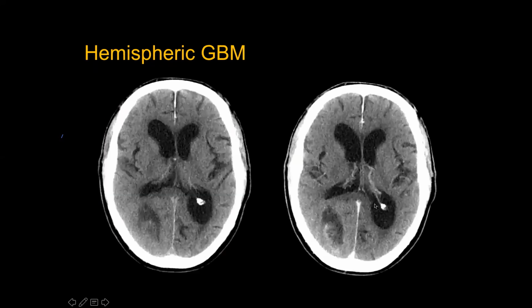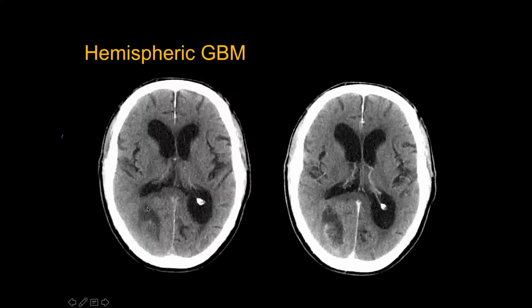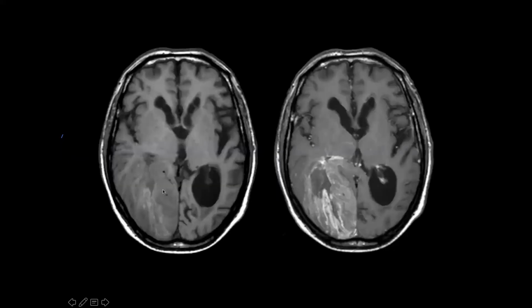But glioblastoma can come in different guises. They can have irregular appearance, solid bits, irregular enhancement, and yet no edema around it. Look at this on CT. It looks just like a solid lesion with no edema, and all these areas are actually tumor on MR. See all this? This is all tumor infiltration, and it affects the cortex as well. And here, it shows that streaky enhancement. Again, this is a very typical appearance of glioblastoma.